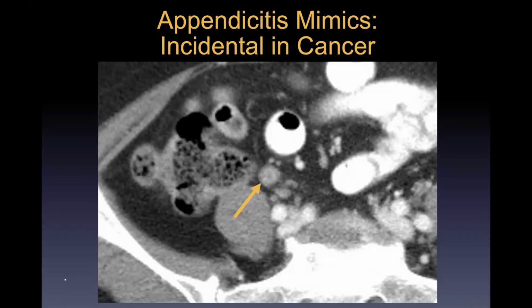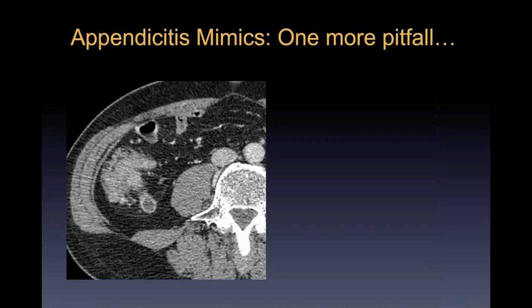And we're not sure why this occurs, if it's some sort of lymphoid hyperplasia, some appendiceal rebound following chemo, something like that, but something that we occasionally see incidentally in cancer patients.